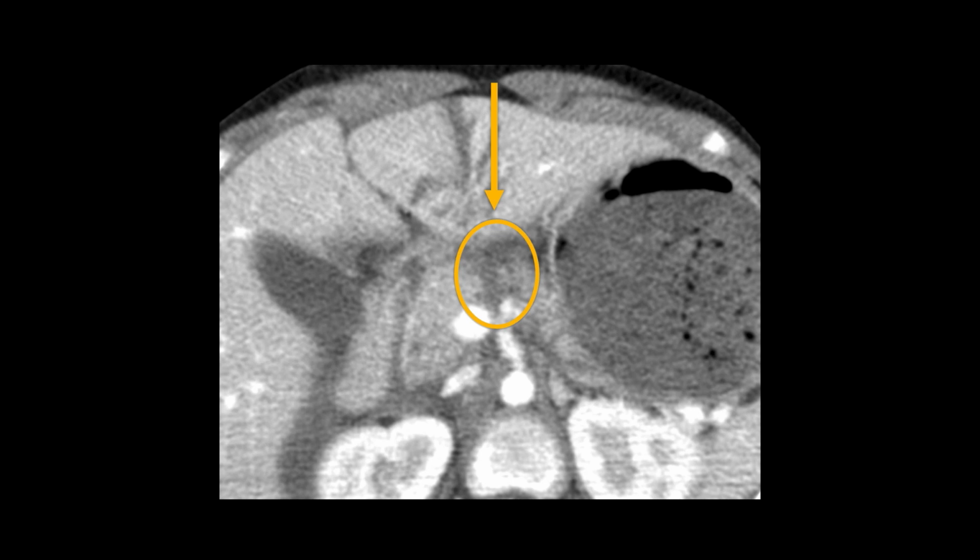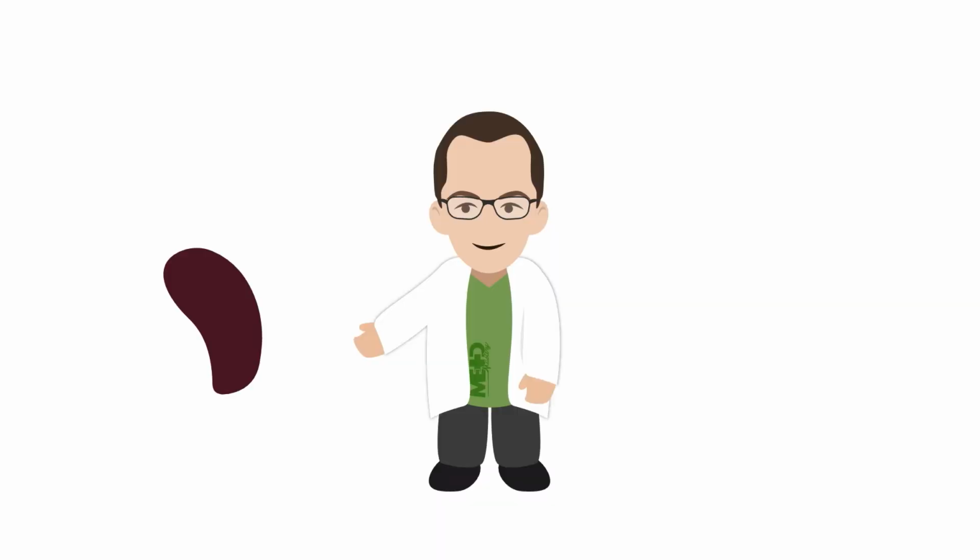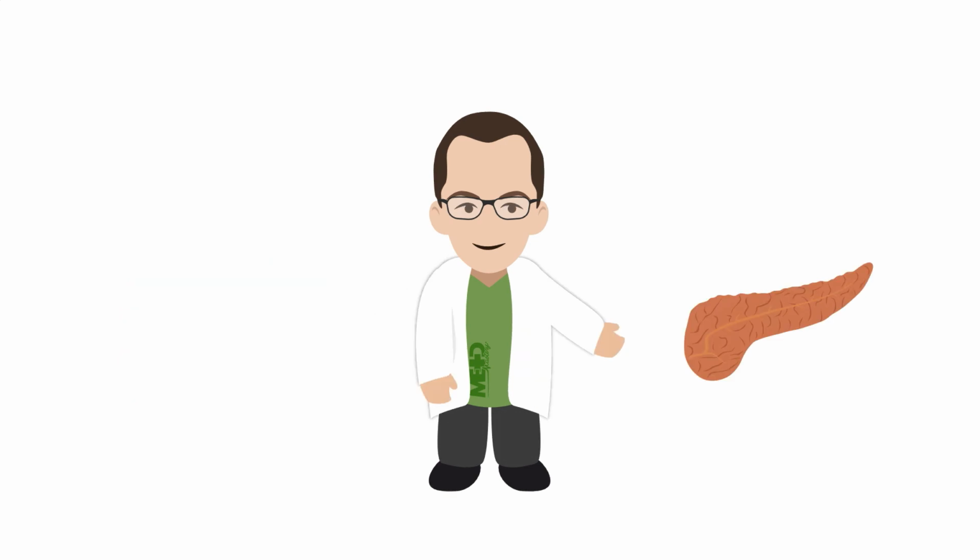The direction of blunt trauma through the anterior abdomen can be inferred from a large liver laceration that points directly at the pancreas injury. In this example, the pancreatic tissue is enlarged and enhances less than would be expected, especially compared to the normal pancreatic tail. This is consistent with a large devascularization injury, which was later confirmed by MRI. Now you can recognize splenic, liver, and pancreatic injuries on CT imaging.